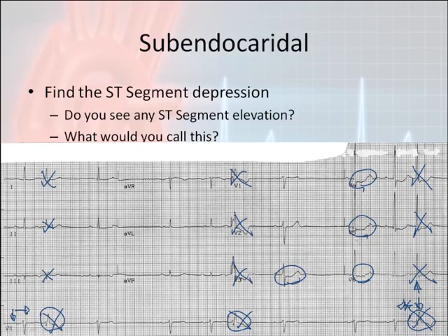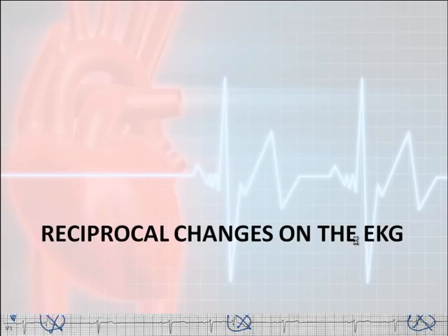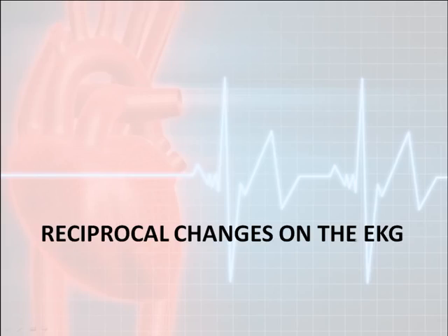What artery would that be affected would be the next question. Possibly the LAD. This might be the very early stages of an LAD occlusion. Reciprocal changes on the EKG.